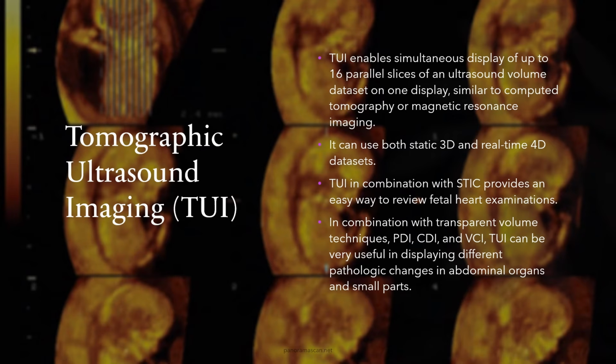To summarize advantages of multi-slice imaging for detailed 3D and 4D analysis, it offers real-time and static imaging flexibility, enhanced clarity in examining fetal heart, abdominal organs, and small parts, improved accuracy in detecting structural anomalies and pathology.